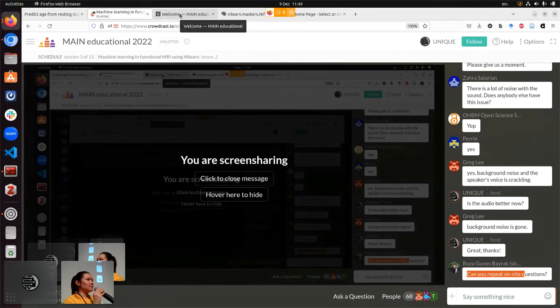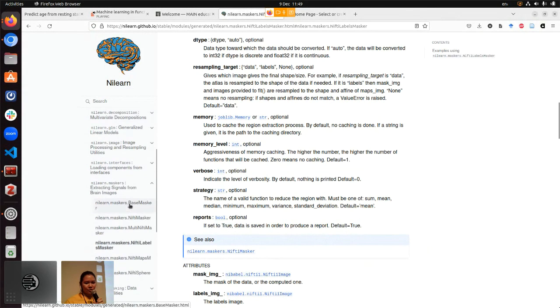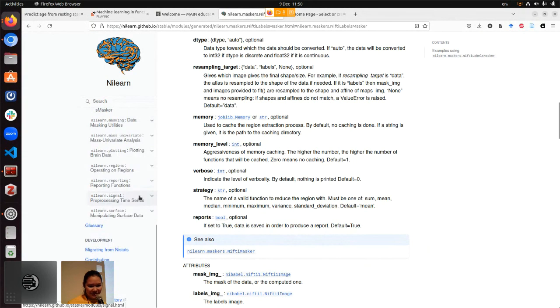But there are definitely some very common types of noise sources that we regress out. For example, one is instrumental noise from the scanner, and usually we handle that with a filter. So I am going to go to one Nilearn function to help me explain this to you.